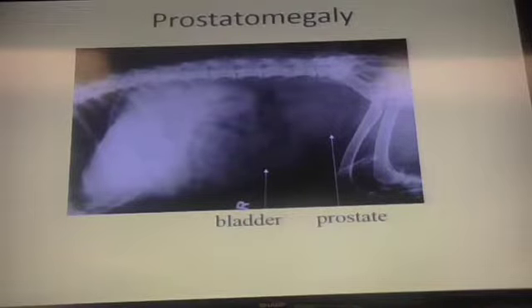Mass in the mesentery, whatever you want to call it, right? But I want you to add retained testicle. Retained testicle. And the reason why I'm bringing that up is because they typically stop right there in front of the urinary bladder.